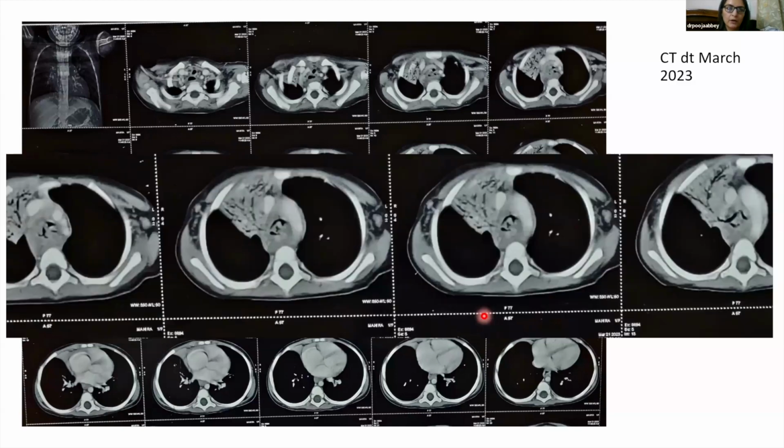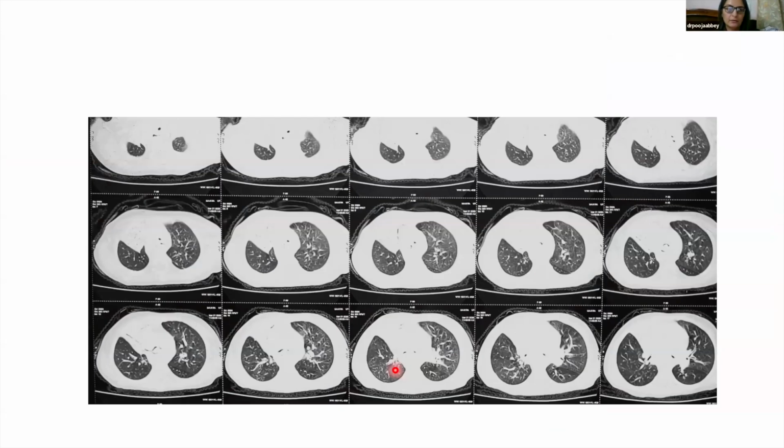And here also, if we see, then probably we can make out that definitely there is some intraluminal pathology happening here. So probably these multiple CTs, I think there were 3 or 4 CTs for this child, but each would have been reported in isolation. So it's very understandable that anyone would come to this kind of conclusion.